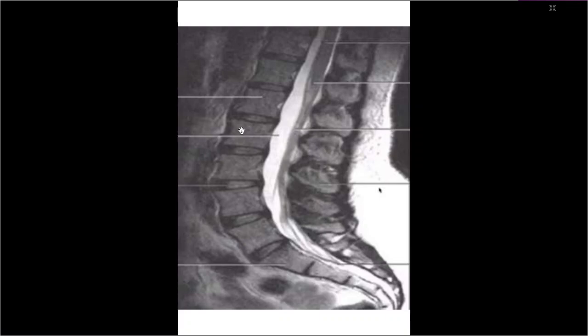So there is one another feature. If someone mentioned this, they are fused. There is no intervertebral disc. What else? The end of the dural sac. No. Okay. Just tell me, there is another specific feature.